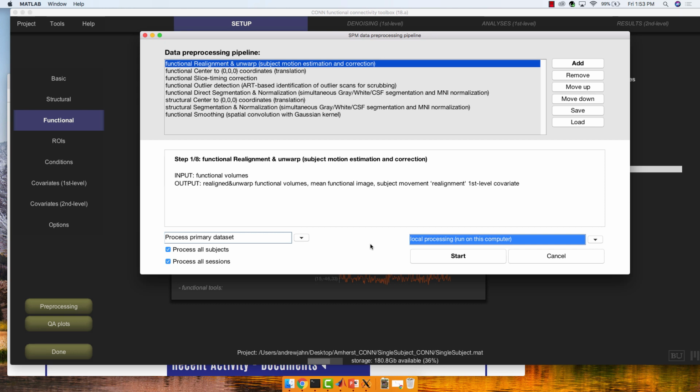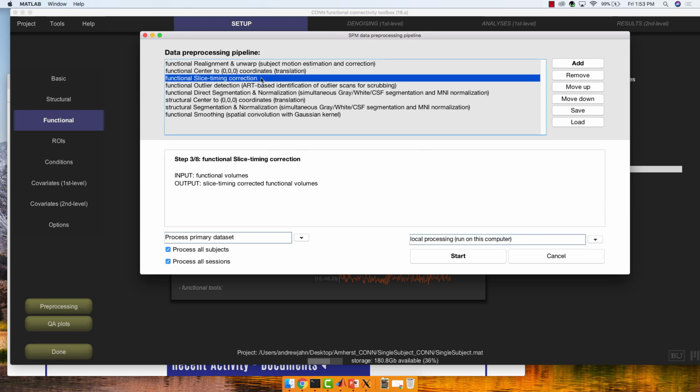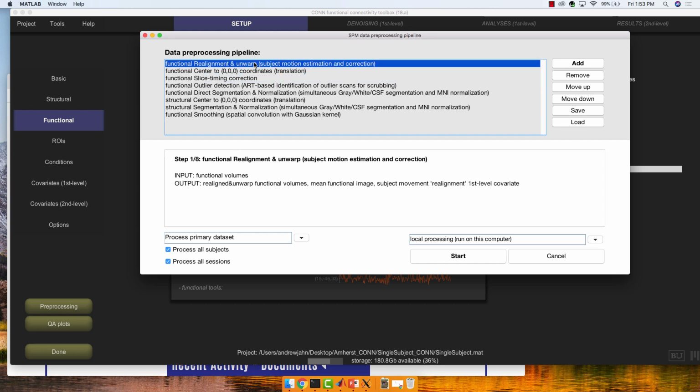Can you see the parameters that are underlying defaults? Like in SPM, you have all these options to select from, to see what is being done. I see what you're saying. I haven't changed them before. What you could do is analyze it outside in SPM. I think in here you can't even see what they've selected. I haven't seen an option to do that.